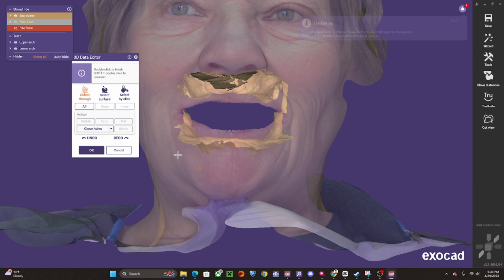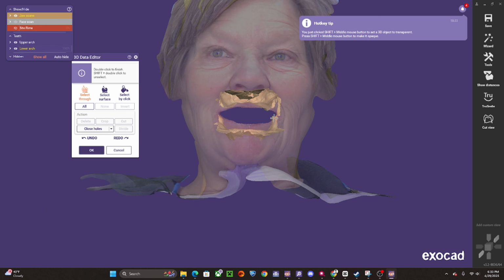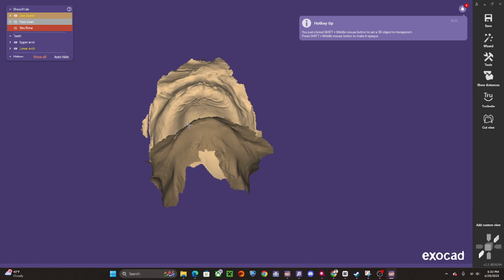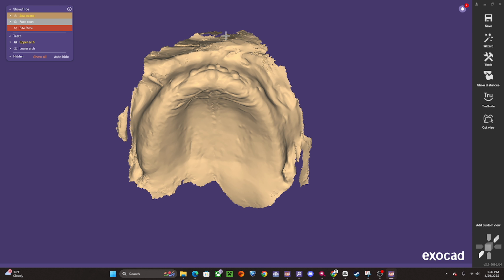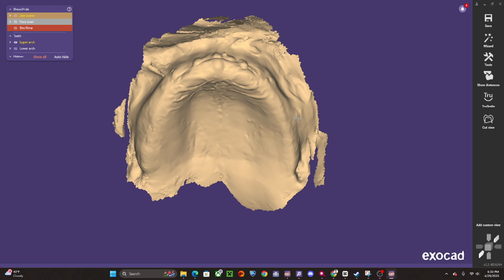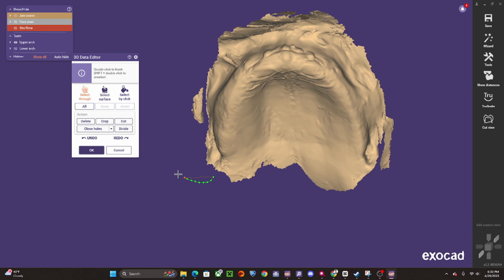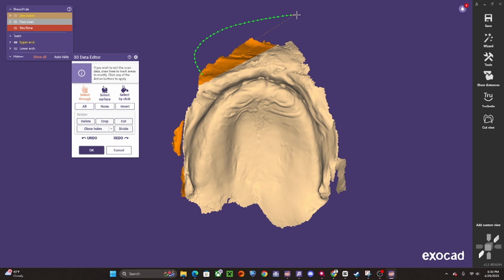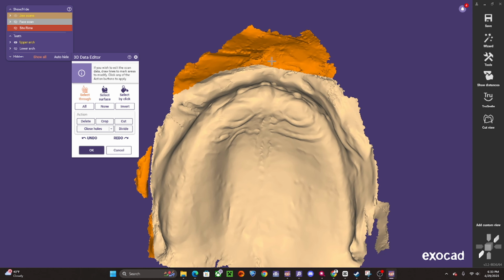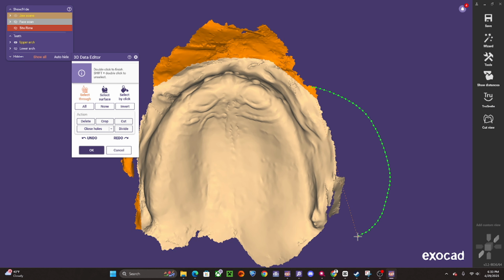And our trimmed face scans in orientation to our tissue scans as well as our bite rim, which is very awesome. So with this data, I do want to take this through the digital model room first. I see some of this flange could go against quote-unquote a digital model trimmer and clean up these borders. So we're going to right-click and edit mesh on these denture-based borders. So I'm going to go around and trim to the bottom of our U, or the deepest part of our vestibular data captured with this retracted tissue scan.